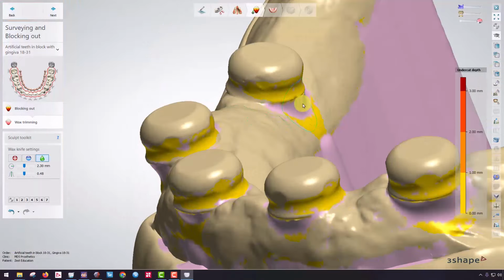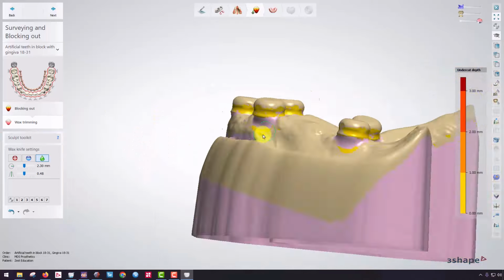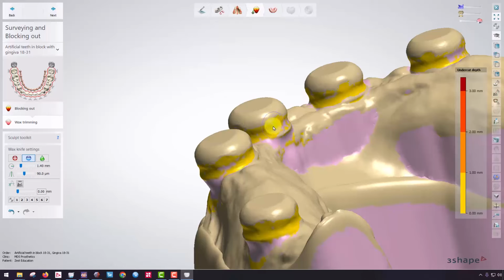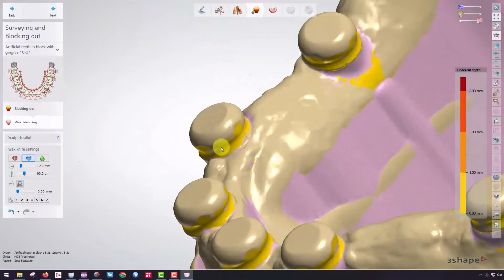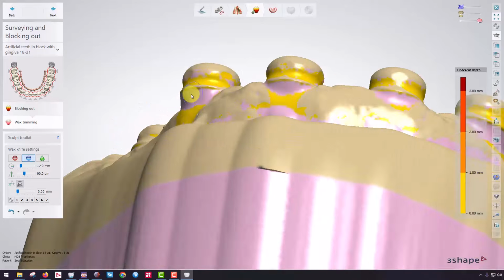Inspect from the side profile, that looks good. Side profile, that looks good. Side profile, do a little bit of smoothing in here. If I add a little too much, I can always come back up in here and then subtract any extra smoothing algorithm, like right in here and like right in there. Overall, here we go. That's looking just about right.